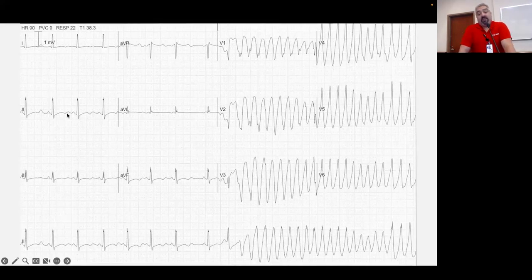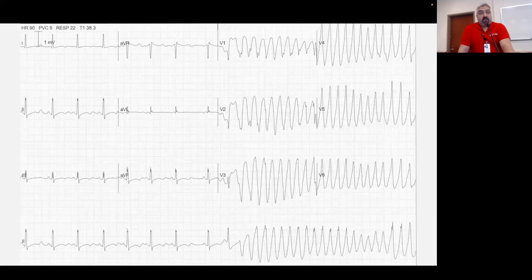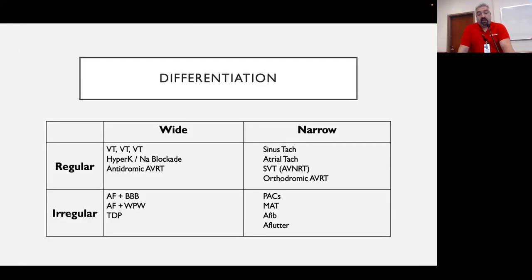So you can see the patient's got a long QT over here. And so this is truly torsades. This one, you can't really tell what the QT interval is going into it, but this is a polymorphic VTAC, okay? So those are your 4 different categories, how you differentiate between them and kind of how you differentiate between the ones within each category. Questions? Or just bewildered?